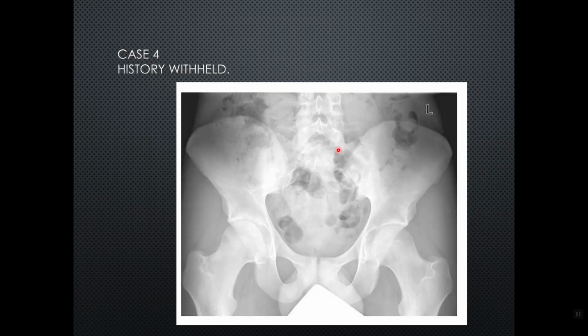In this case, another example of ankylosing spondylitis demonstrated primarily by sacroiliitis bilaterally, not many changes elsewhere. Joint cartilage may be a little bit decreased, but it's very equivocal. So typically both hips are relatively intact. We don't have sufficient visualization of the lumbar spine, but sacroiliitis is clearly demonstrated. Why? Because of that blurring, indistinctness, and loss of the nice white cortical line of the sacroiliac joint. On both sides, bilateral sacroiliitis is highly indicative of spondyloarthropathy, particularly AS.